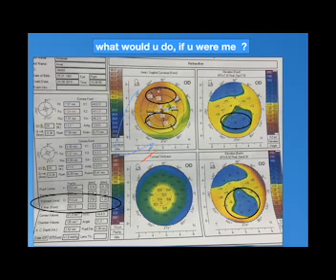I want to emphasize it. The thinnest location Y coordinate is minus 1.2, but still away from the Kmax. The Kmax is plus 3.02. It's shifted up. The Kmax is so superior. It's totally away from the thinnest location. Yes, it will be more suspicious. It will be more guiding if you find the Kmax almost at or close or near or around the thinnest location deviation.